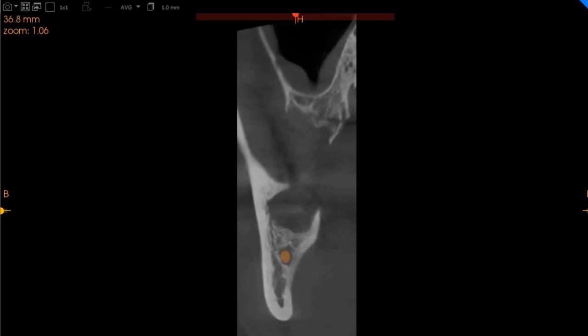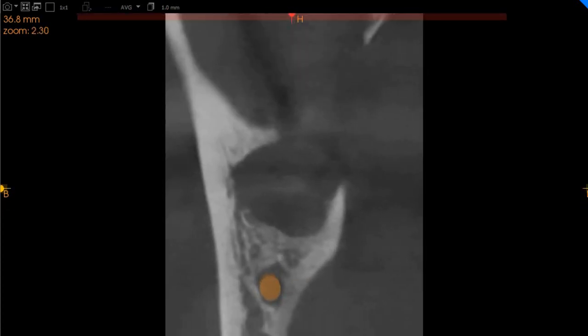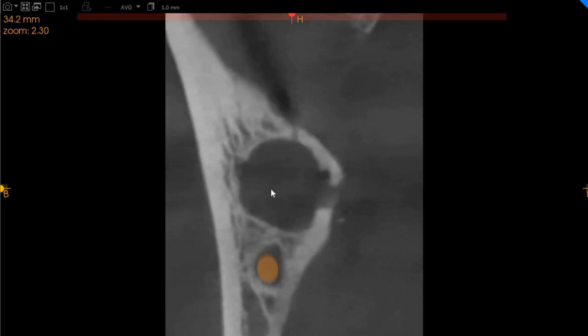No major fragments of the root can be seen. We do see a few specks, which we will show you here, but no major fragments of the root can be observed. But we do see a slight speck here, which can be considered a fragment of the root of the tooth that was extracted right there. This particular area we can assume, because of its radio opaque nature, would be a remnant of the tooth that has been extracted.